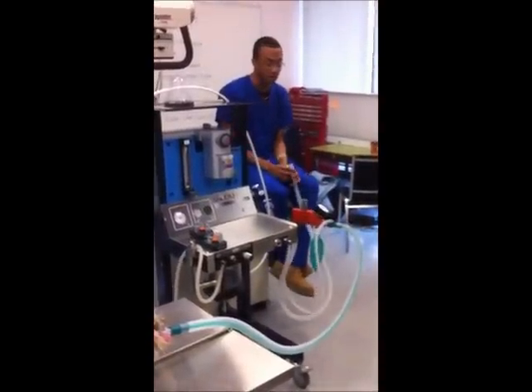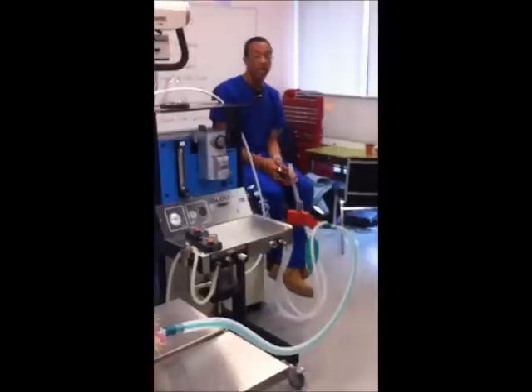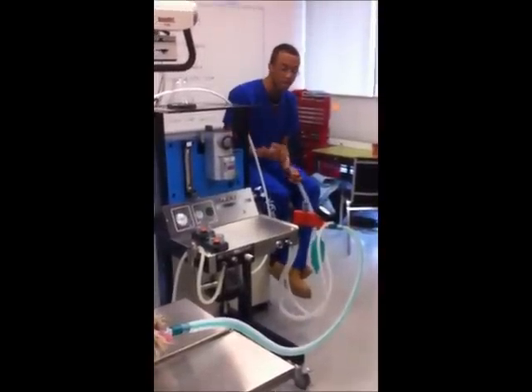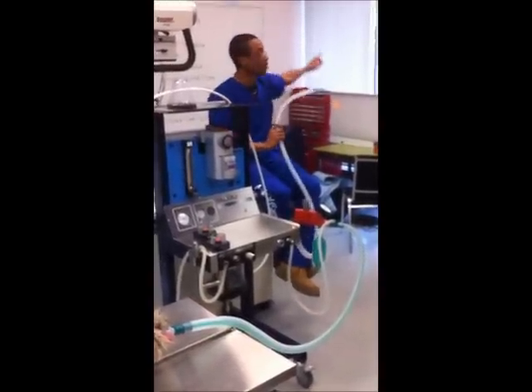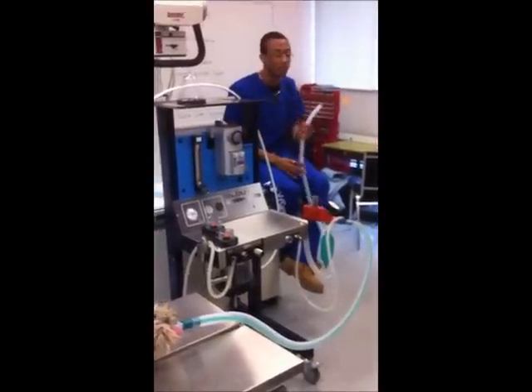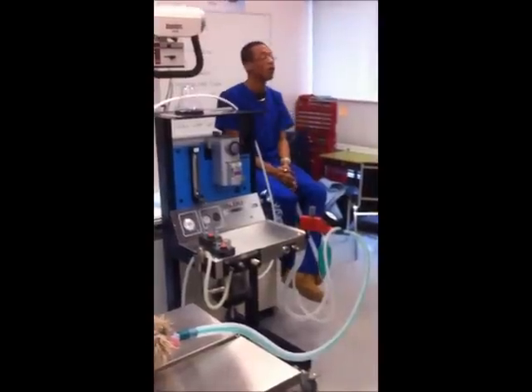What's the next stop after your pop-off valve? Scavenger. So, here you can actually see the difference between the non-rebreathing and the rebreathing system. Fresh gas gets to your patient, fresh gas leaves your patient, out the circuitry, out the building. No filter. Okay, any questions? No?